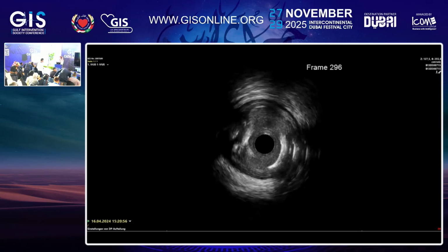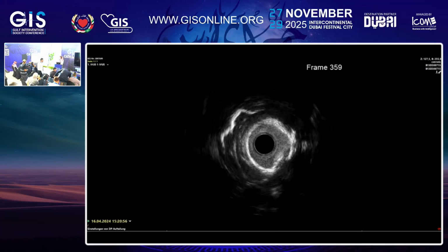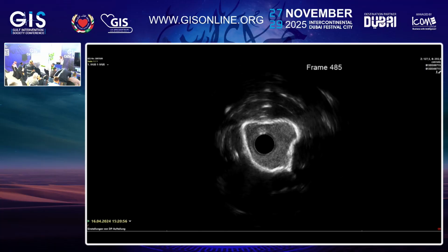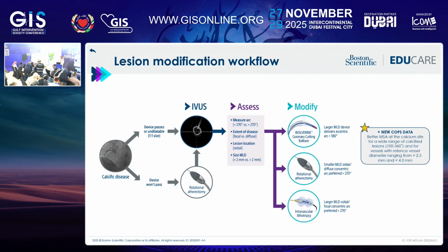So I'm going to find a way to slow it down so we can highlight a couple of things. So a simple question, calcified or non-calcified? Calcified. Very calcified. Okay. Concentric. Excellent. So look at the circle. Is it 360?